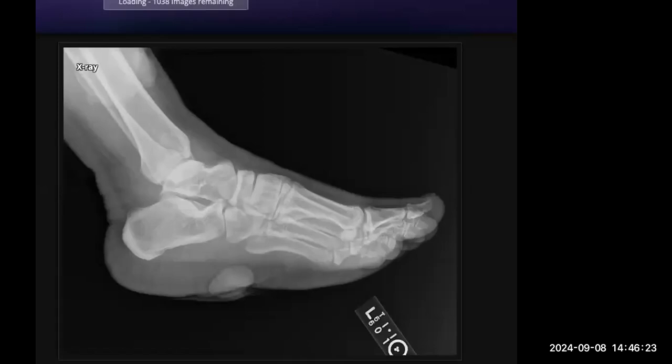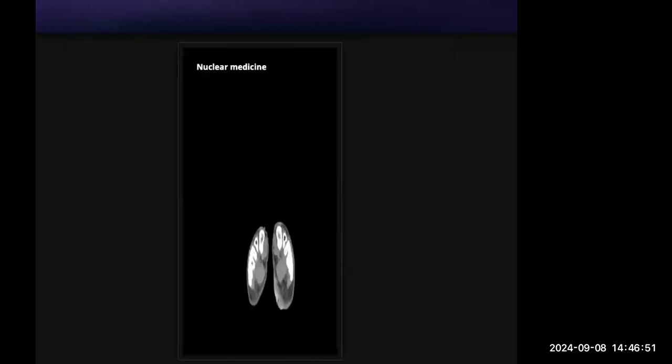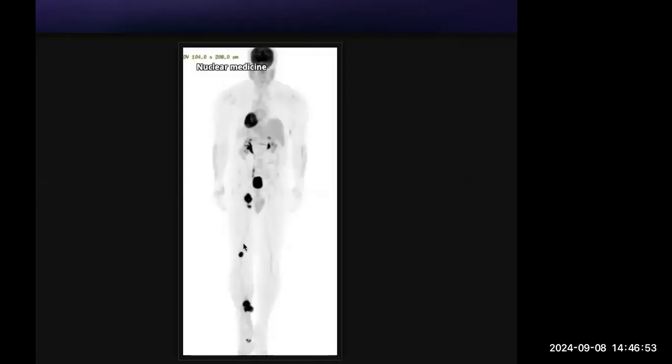Two different lesions could be neurofibromas, or another could be... If I tell you that this patient had a history of cancer, metastasis to these subcutaneous regions is rare, but metastasis can present like this? Yes, it can.